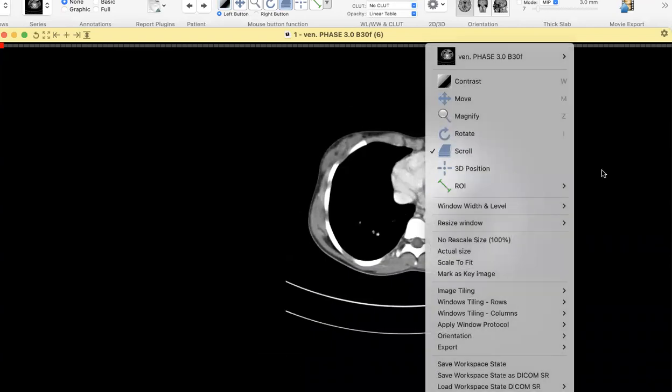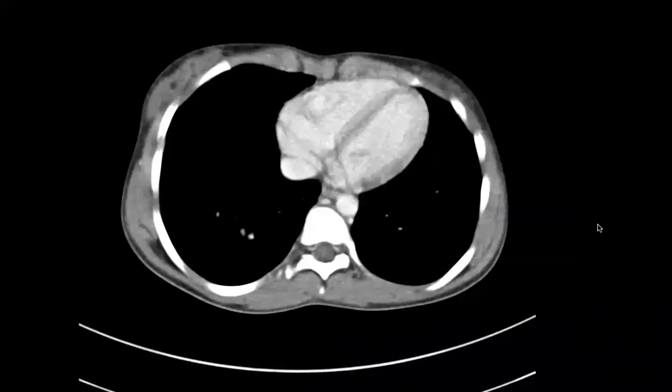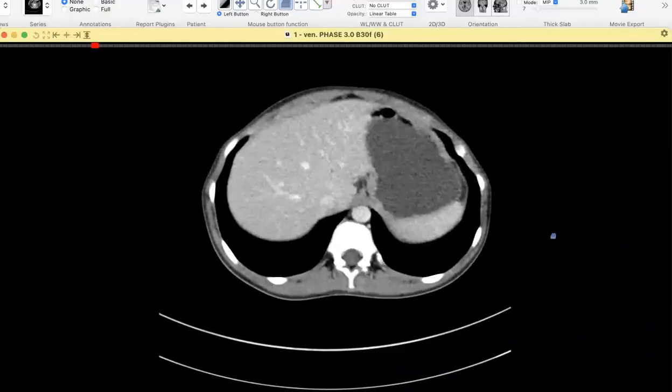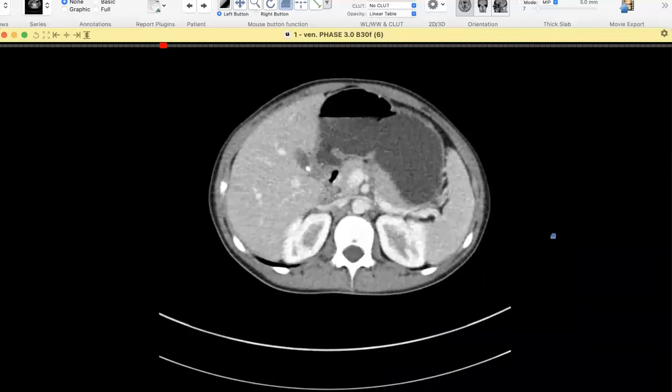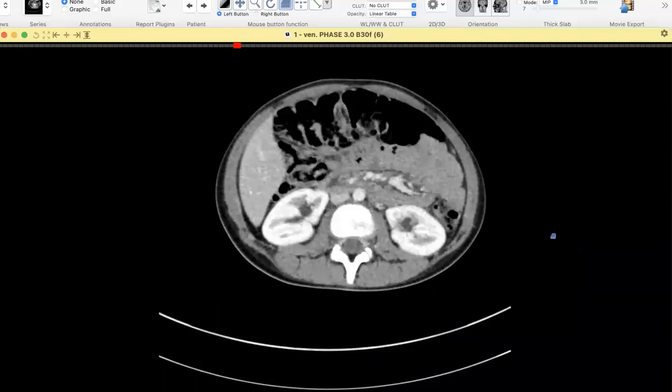Just one second. Let me do it. Just leave the mouse. I just left everything. Okay, fine. So I'm going to scroll for you. So an adult patient with pelvic pain? No. I said a 14-year-old girl with pelvic pain and fever.